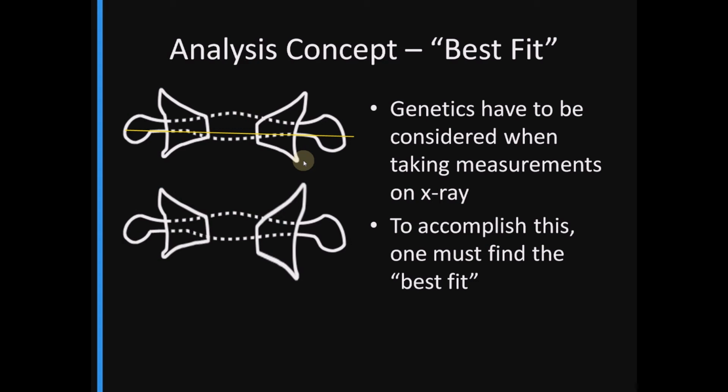So here we have another patient. And this patient, if we were to have our same lines of reference, you would see that the right lateral mass here is very, very tall compared to the left one. Now, that's often a genetic asymmetry where the C2 surface on this side would develop lower and the condyle would develop higher. But nonetheless, the superior and inferior surfaces are in total disagreement, and yet the arch represents a more fair bone assessment of the average structure of the atlas.